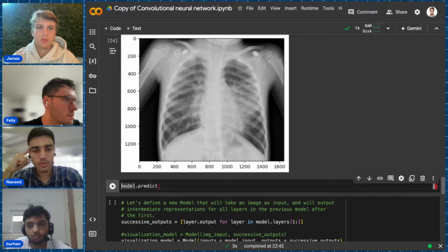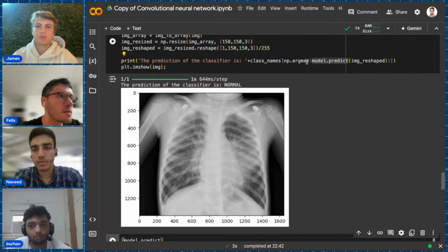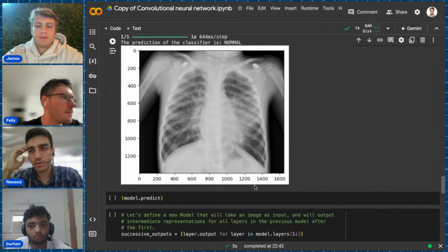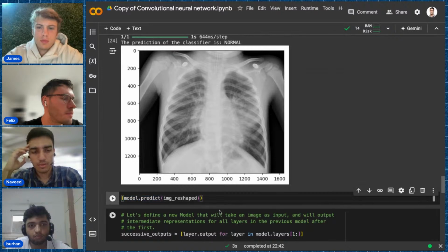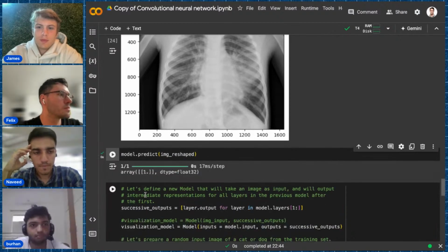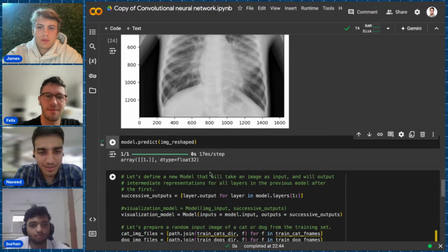Oh no, you can just literally copy paste it from here. You don't have to include the outside parentheses. And just run this separately. Wow, the model is giving a probability of 1.